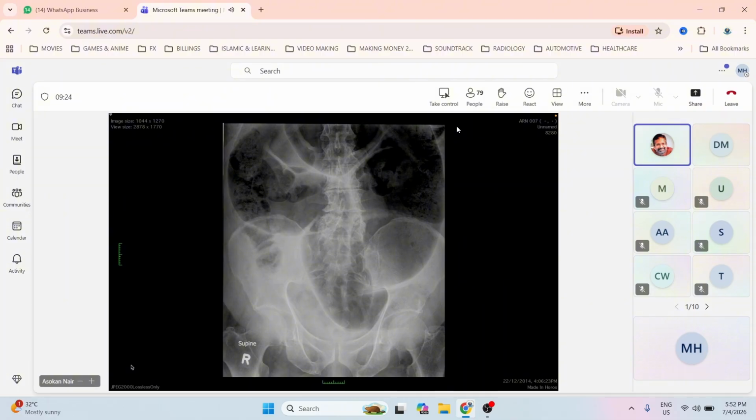Okay, so again, when you describe something, just think like you're on the phone talking to somebody from overseas and you tell them, I have a radiograph in front of me that shows a dilated loop of large bowel, which shows a coffee bean sign. Whoever is listening at the other end will tell you the diagnosis is a sigmoid volvulus. Am I right? So that's what you must do in the exam. If there's a nice word to describe it, just describe it because it's so specific to that condition.